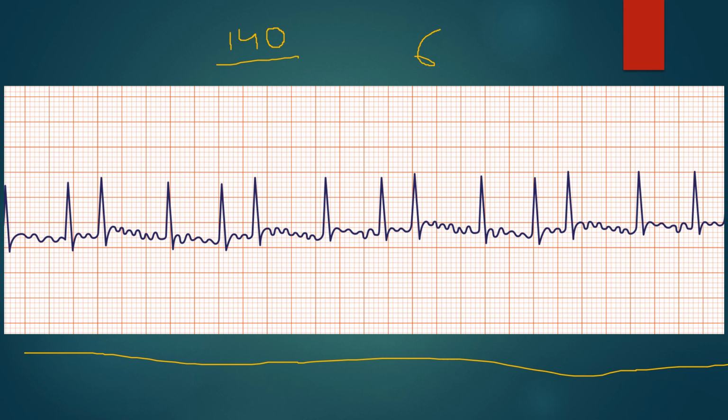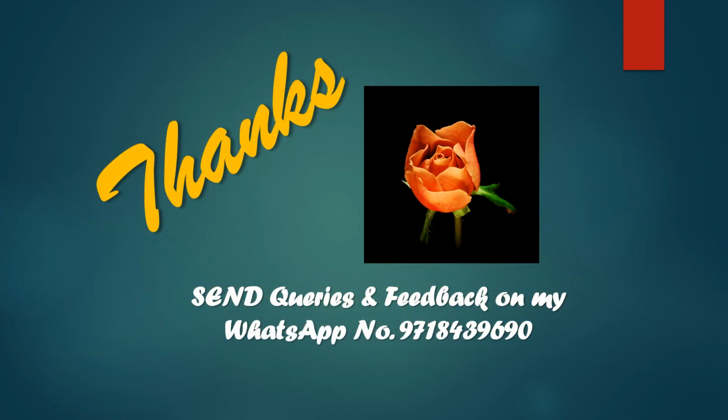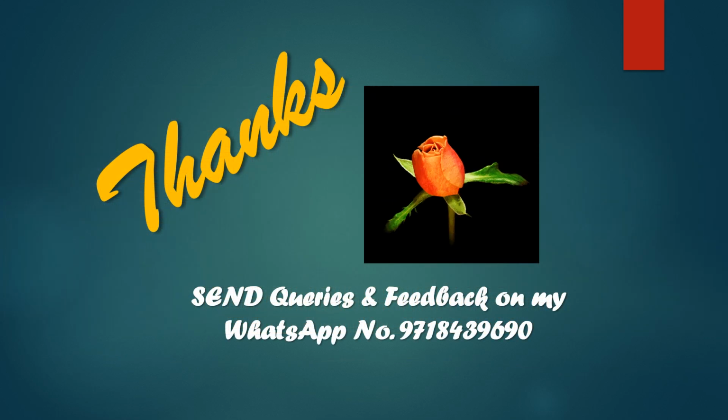And we can see in this example that around the heart rate may be 200 in this RR interval, and somewhere the heart rate may be only 100. So by counting more and more large squares, we can take the mean heart rate. This is how we calculate heart rate in regular rhythm as well as irregular rhythm.